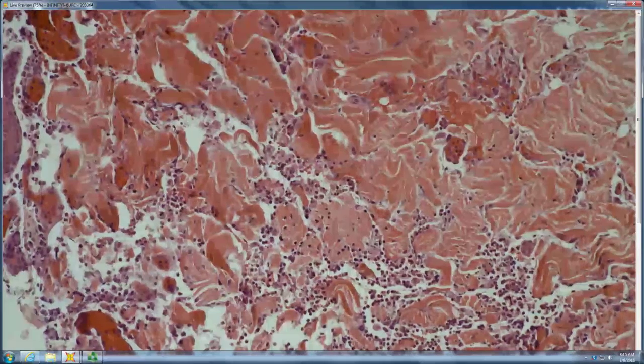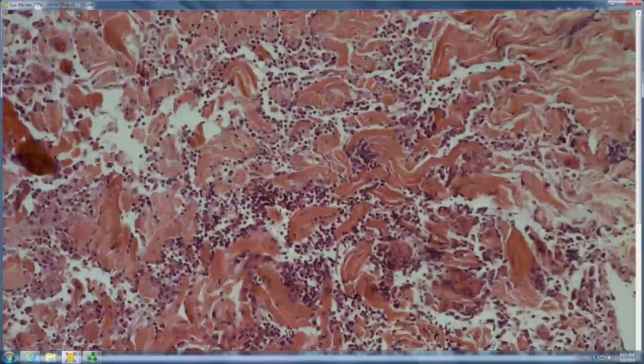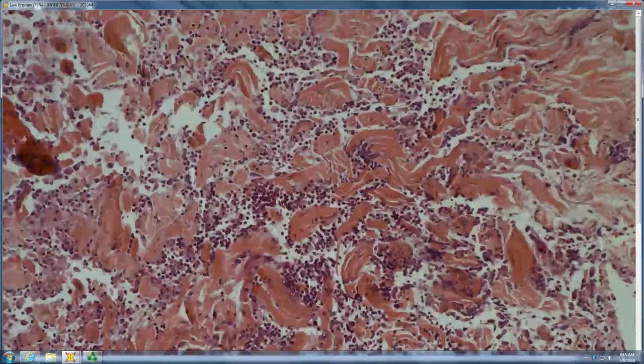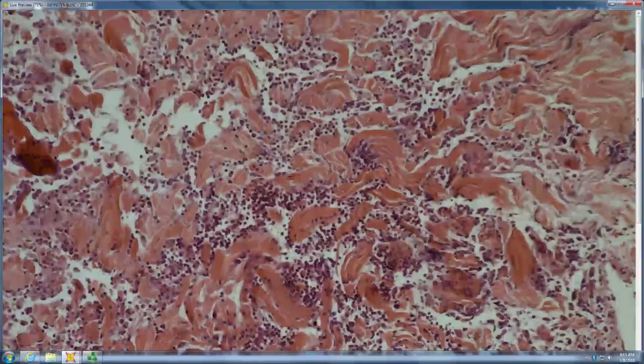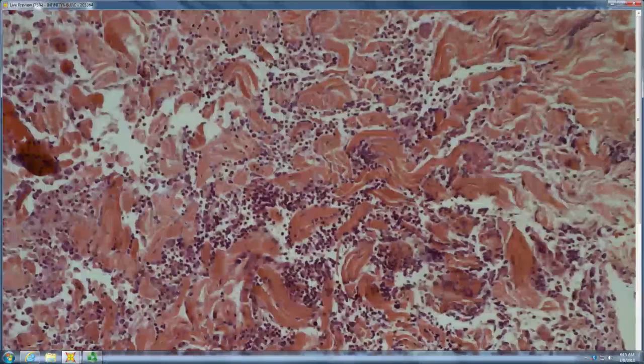Sure. And basically, you've got interstitial neutrophils almost to the point of abscess formation, and then you have, see that multinucleated cell? So you're basically looking at a combination of suppurative and granulomatous dermatitis. AFB, fungal, syphilis would be, on the infectious side, the things that you'd want to look for, and this one grew an atypical mycobacterium.